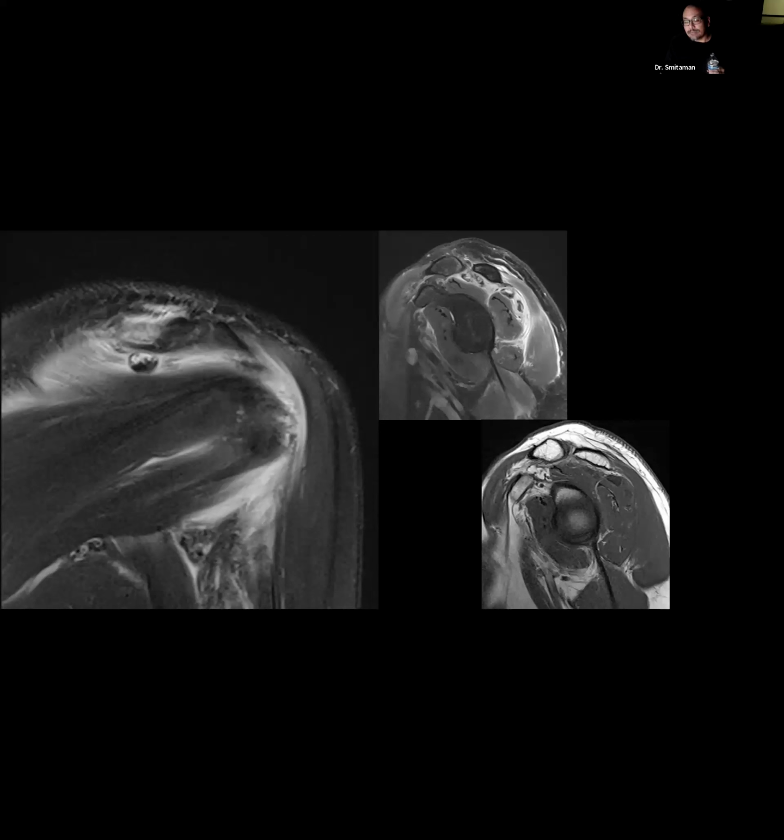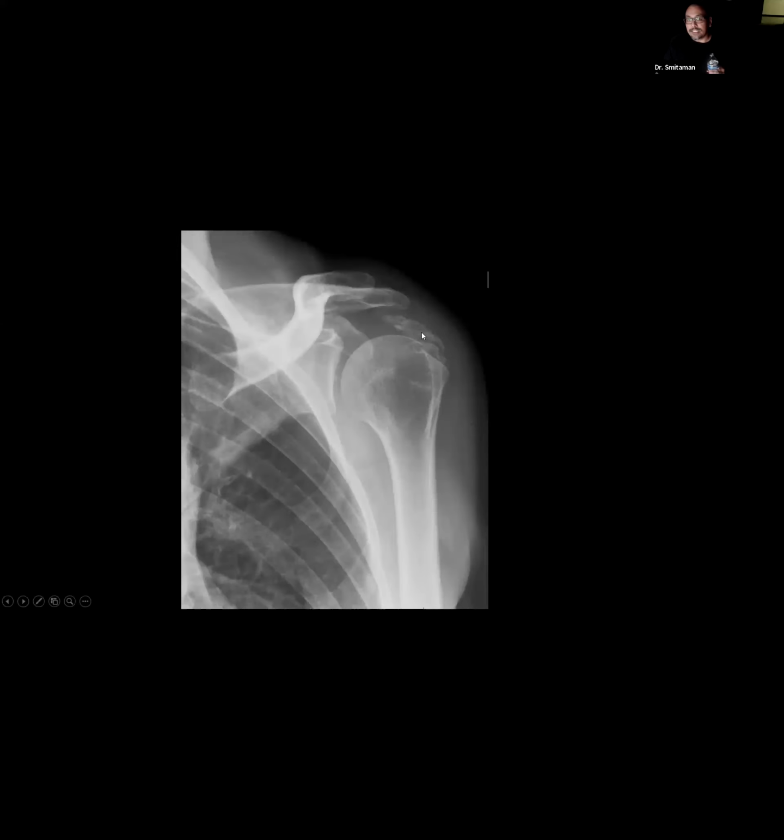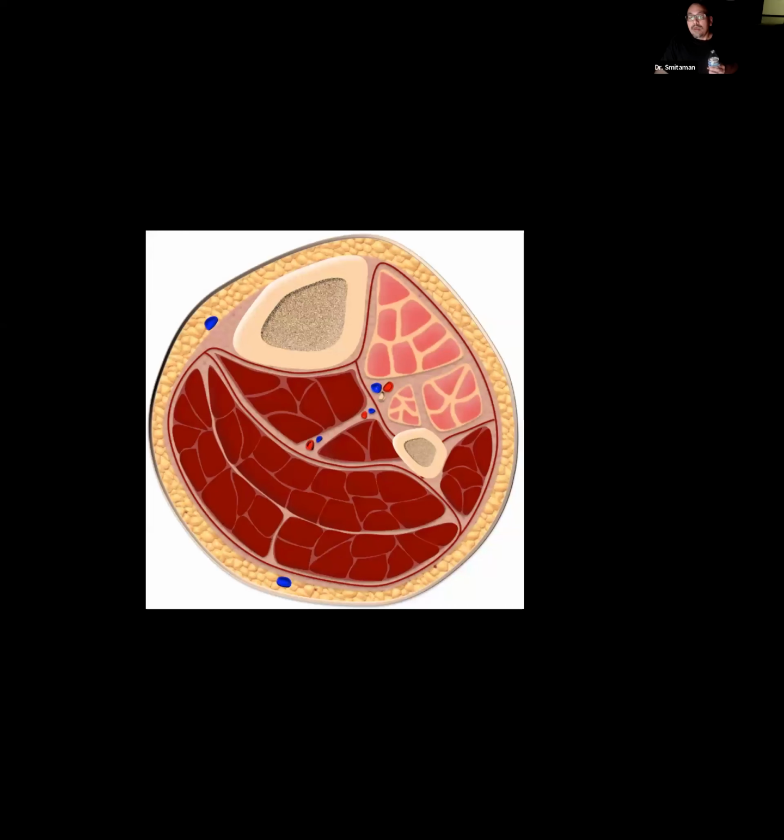Okay, and sometimes, as we know, this can also track into the bone and cause a robust edema, in which case it may be misdiagnosed as a tumor or perhaps osteomyelitis. What helps us, obviously, is radiographs or CT displaying that calcium. Okay, so this is just a nice case of basic calcium phosphate with muscular extension. Okay, so something to think about.